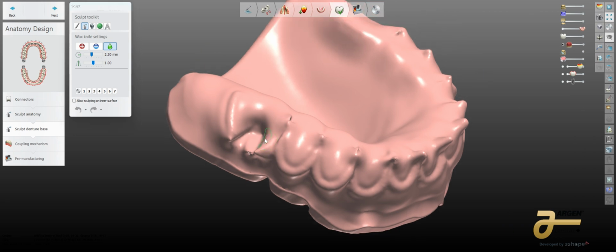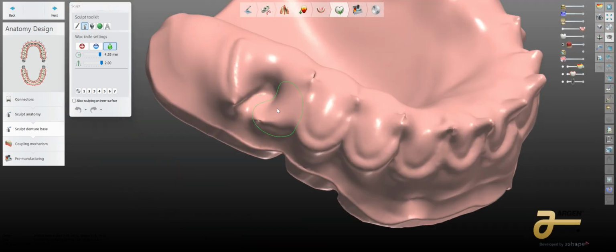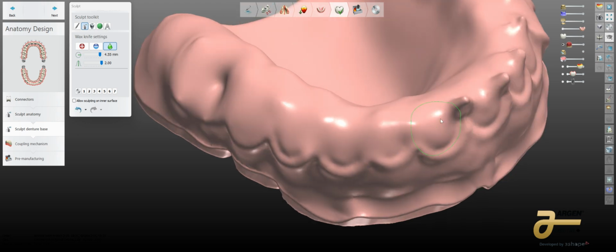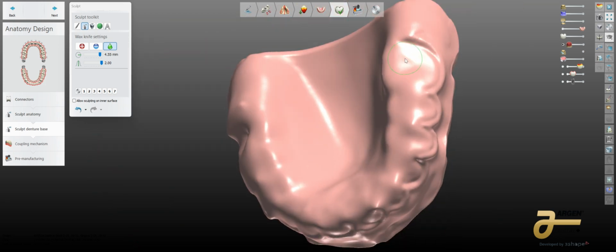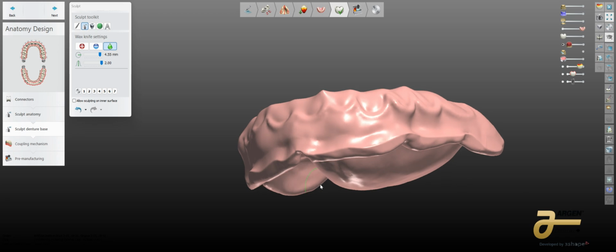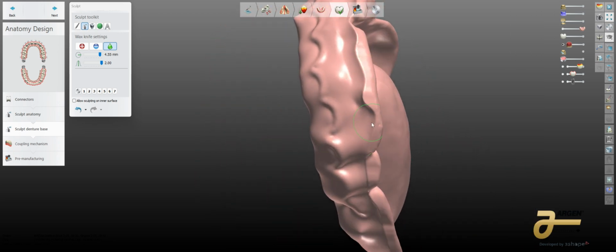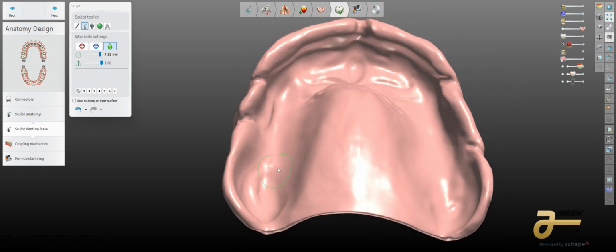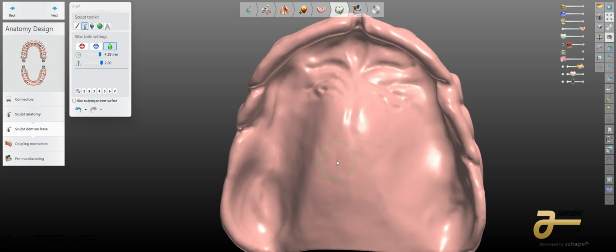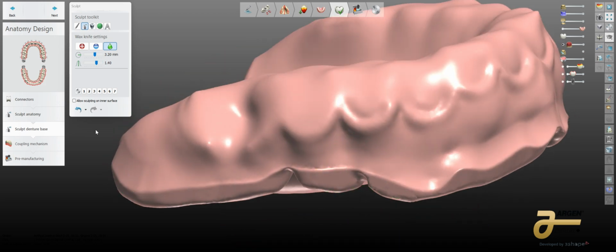And really quickly, the most important part on these things is to not have these jags on it. So I'm going to come in here real quick. I'm just going to smooth it out and get rid of these little protrusions that are coming up. And just look at where we're at on this aspect of it. Now, again, if you remember, this outside edge was to the outside of that model. You can see a really nice peripheral roll following all of that muscle trim there. So I don't want to lose that aspect of it, but this outside edge is rather easy.